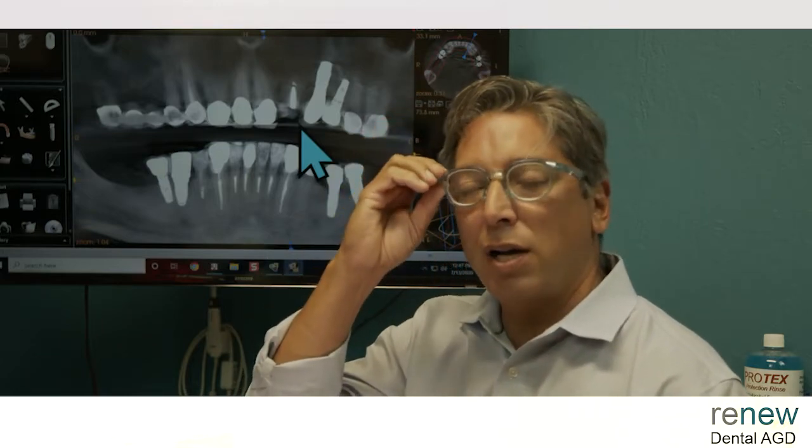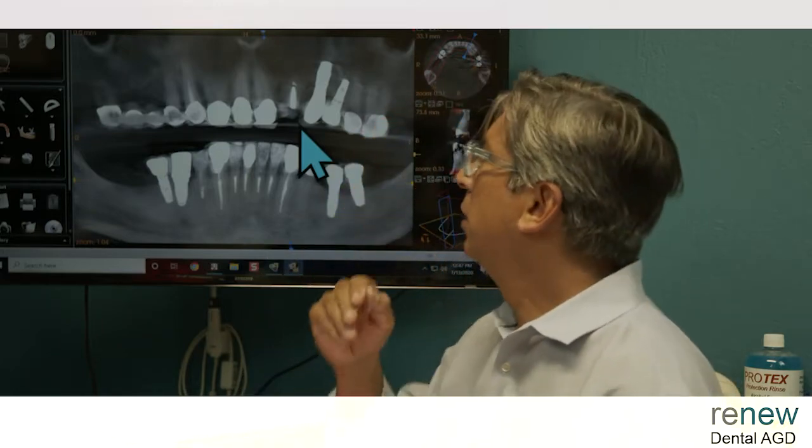Cases that we do here as they come in, just so we're looking at how to use the CT, how to make a judgment on what kind of treatment would actually work out well. This patient has pretty good assessment quality, so let's look at that real quick before we get into the CT.